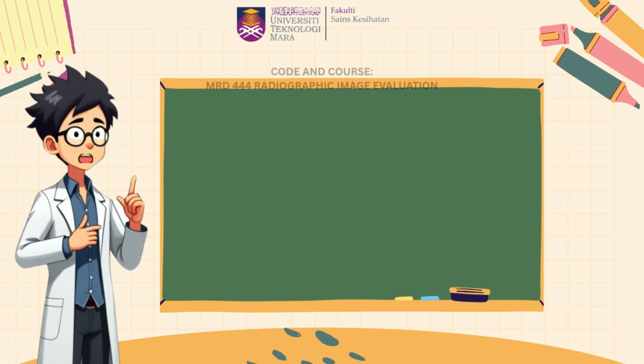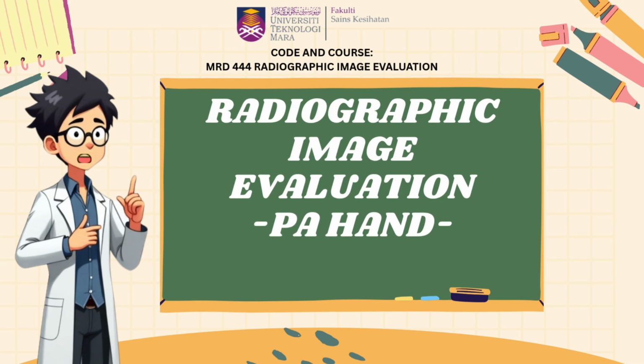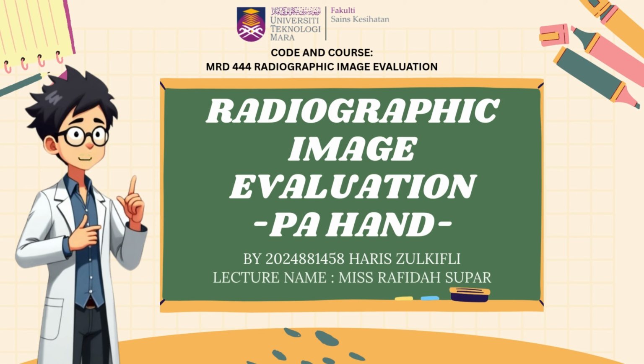UITM Puncak Alam. In this video, I will be presenting an overview of the radiographic image evaluation of the hand in the postero-anterior projection. If you find this video useful, feel free to share it as a learning resource for understanding the evaluation of PA hand radiographs.